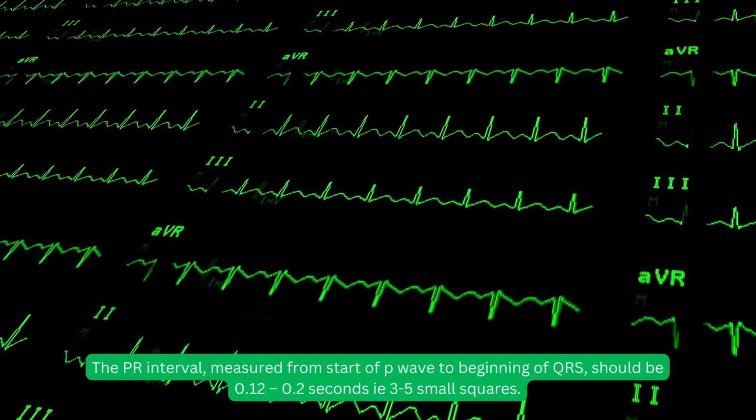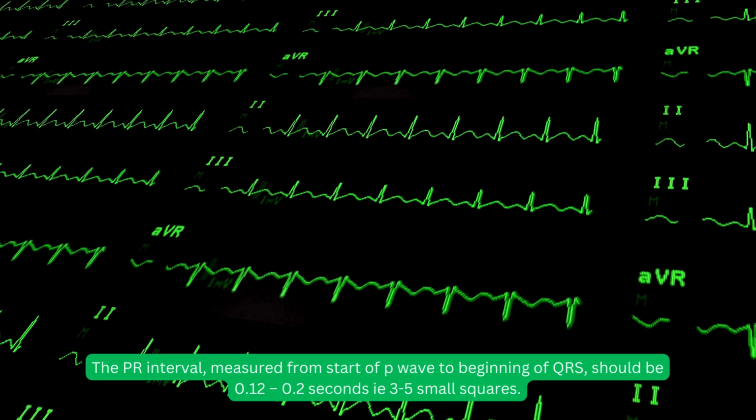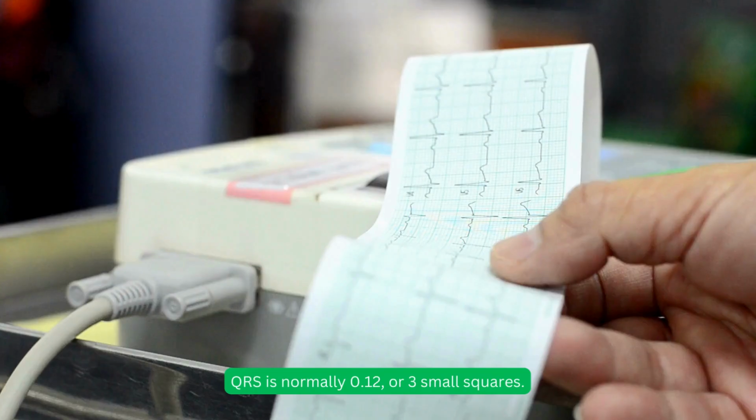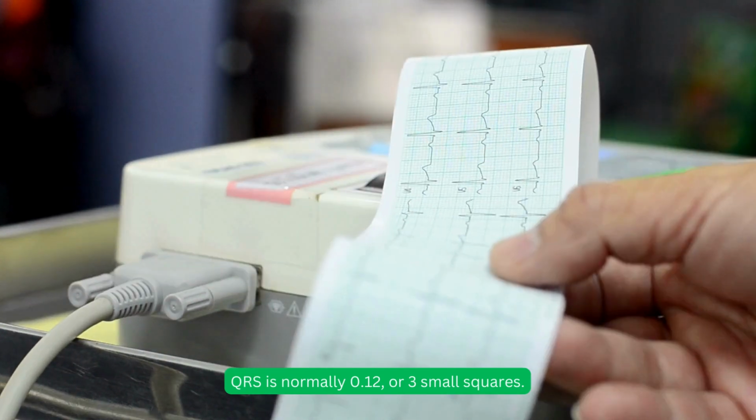The PR interval, measured from the start of the P wave to the beginning of the QRS, should be 0.12 to 0.2 seconds, i.e. 3 to 5 small squares. The QRS is normally 0.12 seconds or less, 3 small squares.